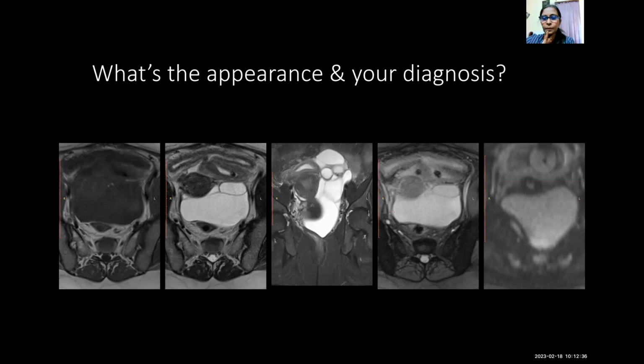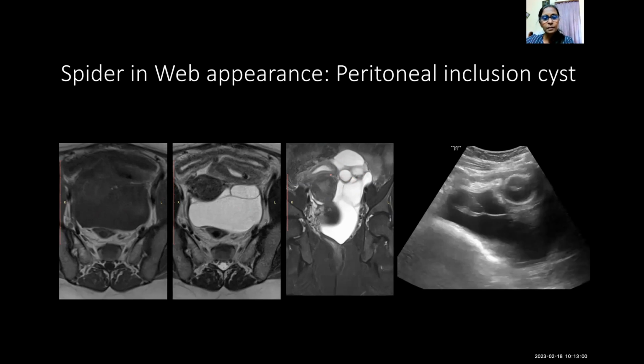Yes. So there's a multilocular region of fluid adjacent to the uterus. All right. It's in the left adnexa. So it's Yeah. in the left adnexa. That is the ovary, which is sort of Yeah. in the center. So that is a very classical spider in the web appearance. Okay. Yeah. So sorry, I passed it on to Nick.